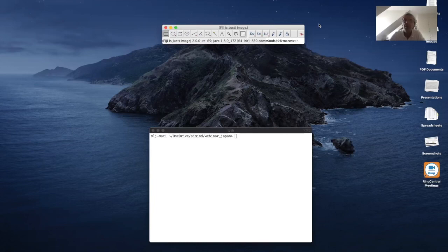So now let us see what the simulation has given us. I have already simulated this because it takes some time. So now I have two cases, one with interaction and scatter in the phantom and one without. And I will add noise to both of them. So I go down here, and the first one is called VB1, and that is without interactions, and I add noise with the BIM program.